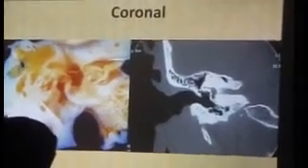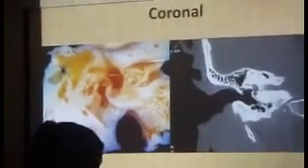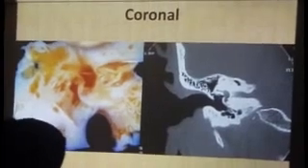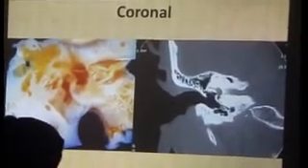Okay, and this again in radiology terms is called the braid hanging from a branch, because the lateral semicircular canal is supposed to be the branch, and the tympanic segment is supposed to be the solitary braid hanging from that branch.